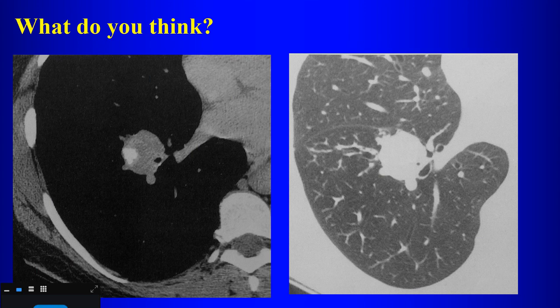It's calcified. What about the calcium? Is that a granuloma or is that something else? No, it's not central, so it's less likely to be a granuloma. The fact that it's eccentric calcification means that you do have to think about neoplasm now in your differential diagnosis if you have eccentric calcification.